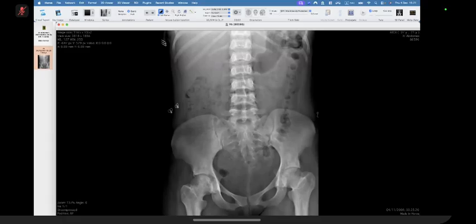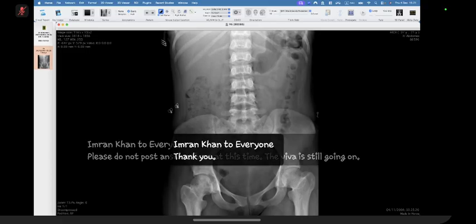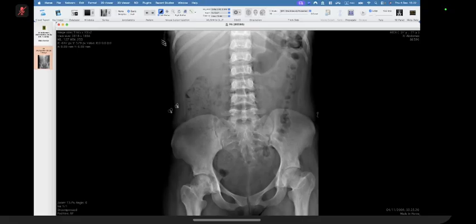Pubic bones bilaterally appear normal. Trochanters appear normal. So I would like to correlate my findings, as there's some sclerosis apparently of the ribs as well, but I would definitely check other radiographs to confirm, because there's patchy density of the visualized vertebrae as well. So I would like to know if there is a diffusely increased bone density of the vertebral body and the ribs, or if that is just projectional for the ribs. Because for the pelvis, the density appears to be normal, except the femoral head I've described.